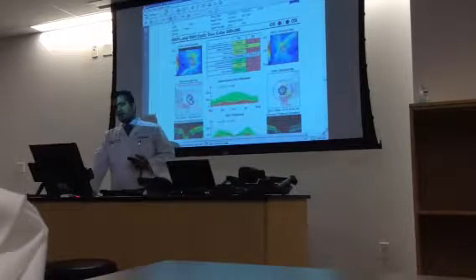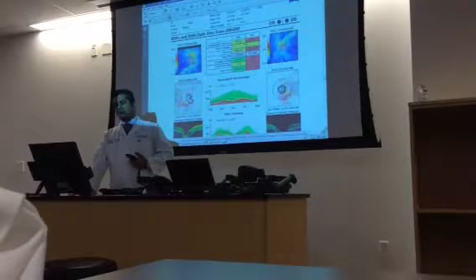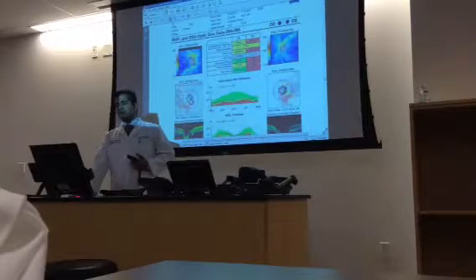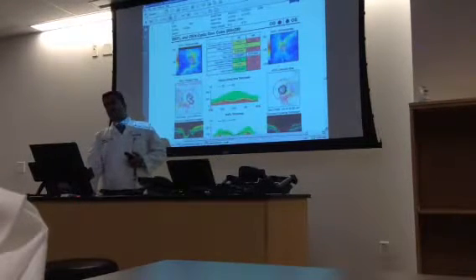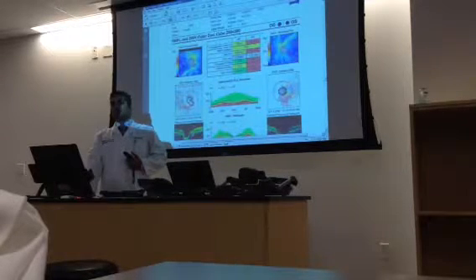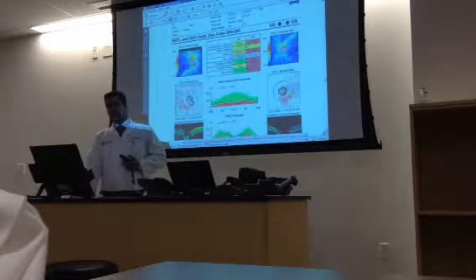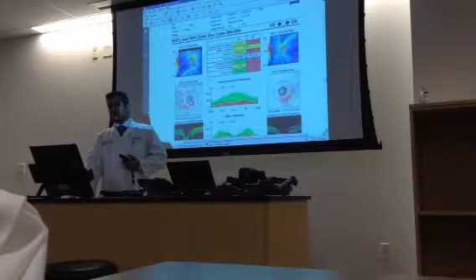The rest of the parameters, average retinal nerve fiber layer thickness, retinal nerve fiber layer symmetry, rim area, disc area, they're all color-coded. Disc area, most of the time, if they are outside normal limits, outside normal ranges, they are in gray. Any parameter that is in gray means the range is outside the measurement variables obtained in the normative database. It does not mean abnormal necessarily, it just means that the machine does not know whether it's normal or abnormal. That's when you have a box shaded gray.